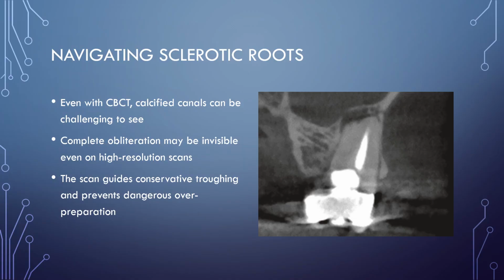While intraoperative CBCT is an incredible tool for finding that initial target, you must approach the interpretation of sclerotic roots with realistic expectations. Even with the advanced, high-resolution, and small voxel size of a CBCT, completely calcified canals can still be exceptionally challenging to see.